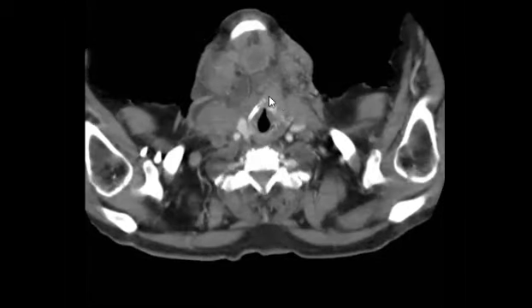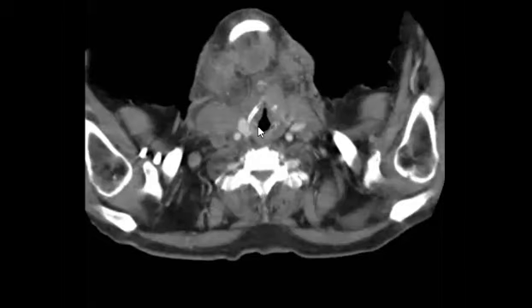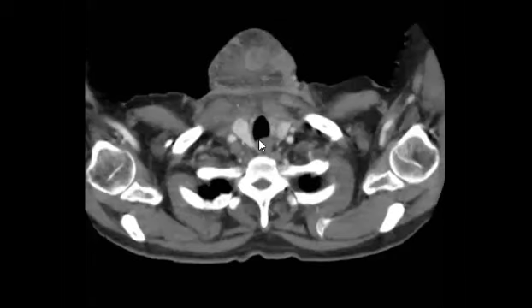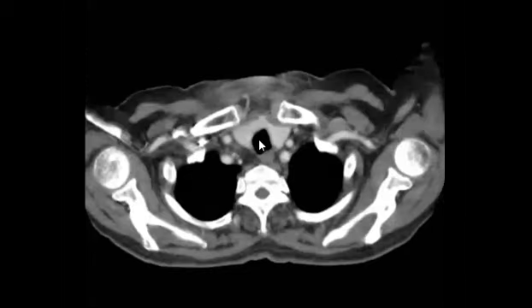Can you see now the soft tissue? Much easier, without encroachment from these bones. Yeah. So the left internal jugular vein is already partially thrombosed. You agree? And the right, probably you cannot see it. Do you agree?